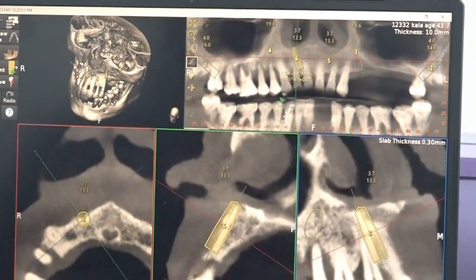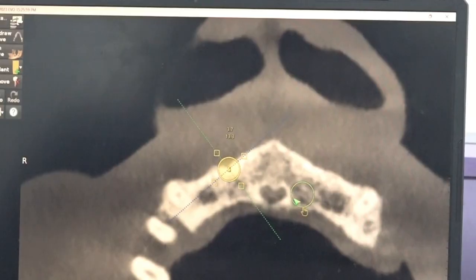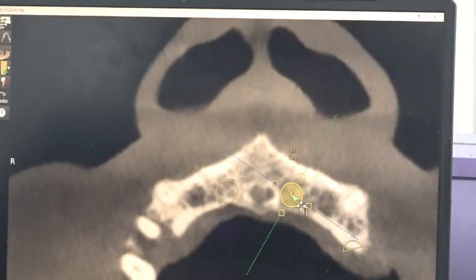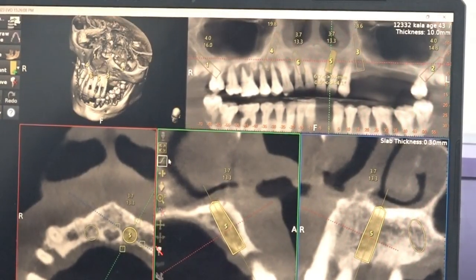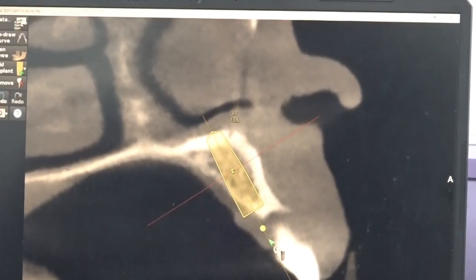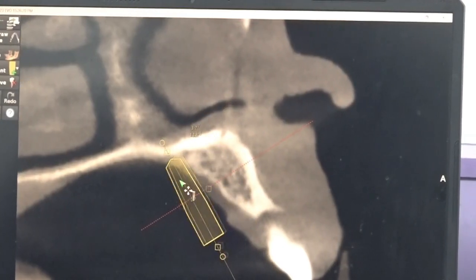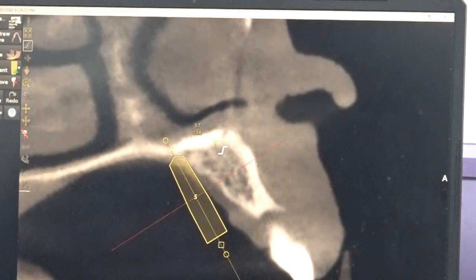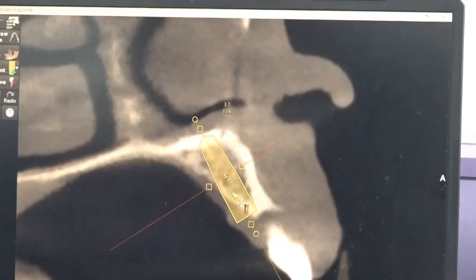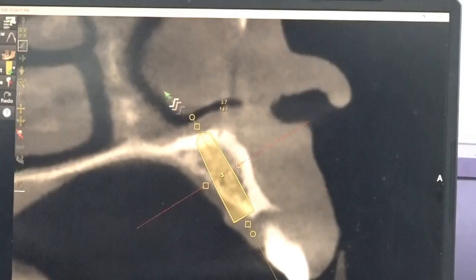So anterior, the axial implant, just lateral. So this is the nasopalatal canal. The cross section is a little heart shaped. Two implants lateral to the nasopalatal canal. That is probably between the central and lateral. So most of the time it will be in the central and lateral. So a mild palatal approach, instead of going like this, we are going palatally. Fortunately, the nasal cortex is very thick, 3 mm, and very cortical, and this bone is also good. By palatal approach, 1 or 2 threads may get exposed palatally, that's it. 3.7 by 13.